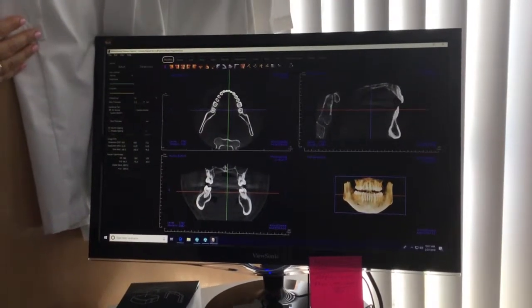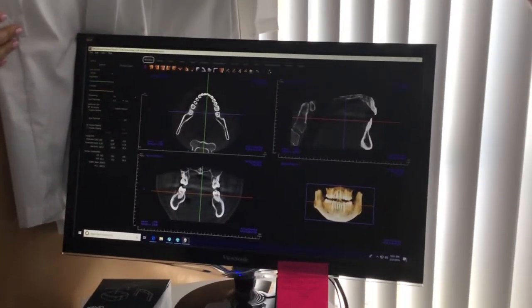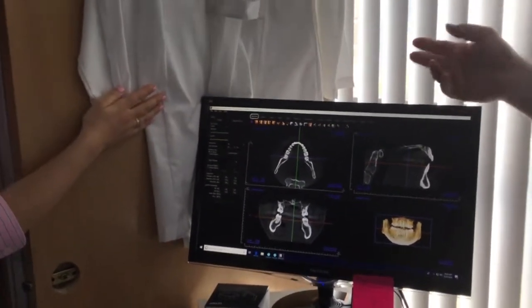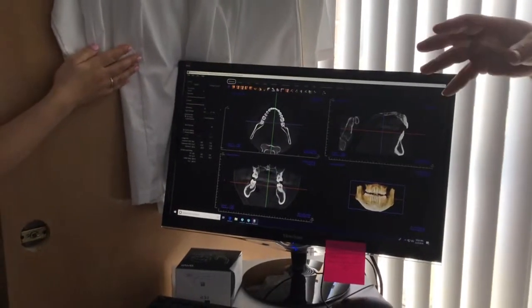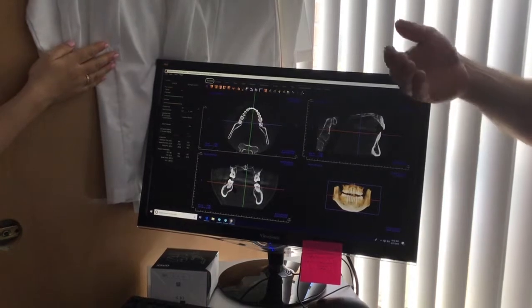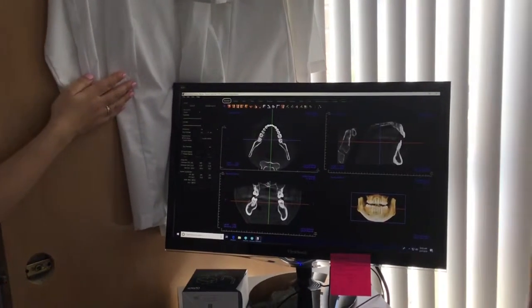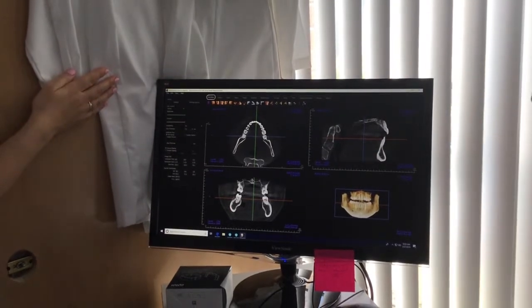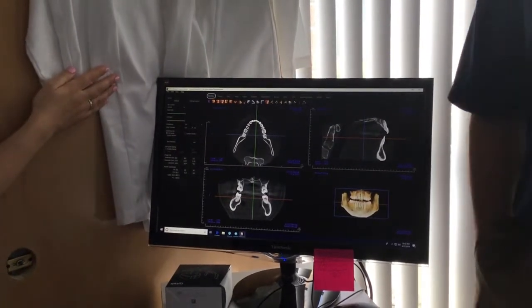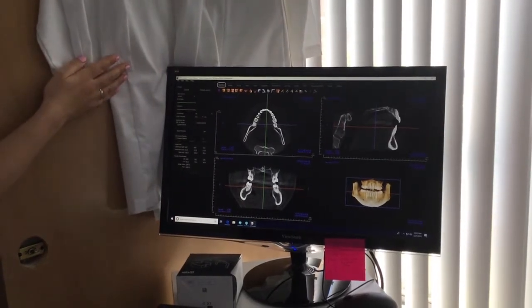It's saved on your network as well. So we're saving two copies of it to your network. One will always live in Dexis and hang out with Dexis, the raw file. The working file, if you're doing anything with it, planning a case, looking at stuff, that's what you should do that File, Save As for, so you can just view it everywhere else. Everything's always saved on the network, so as your server gets backed up, this backs everything up with it, which is better.